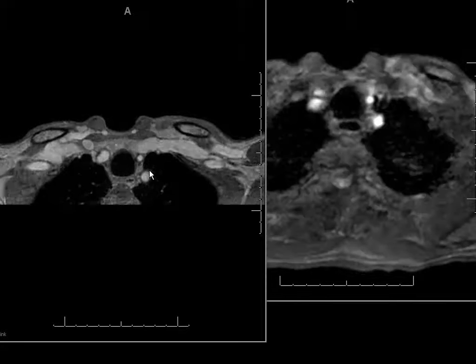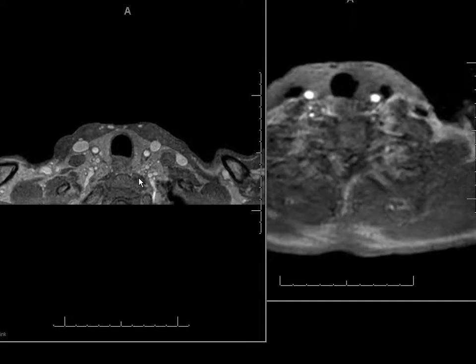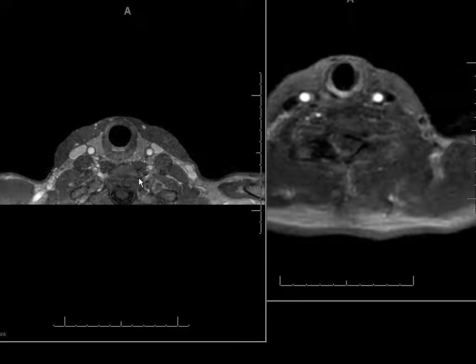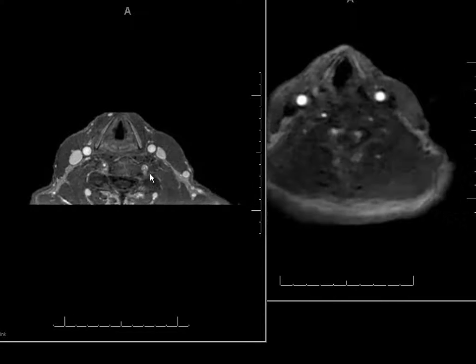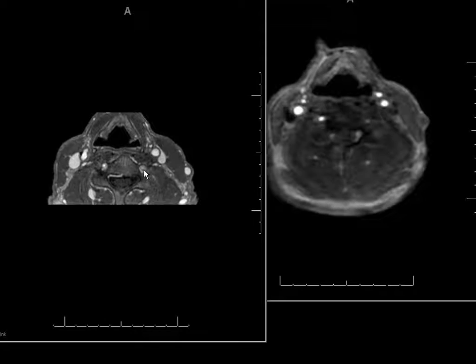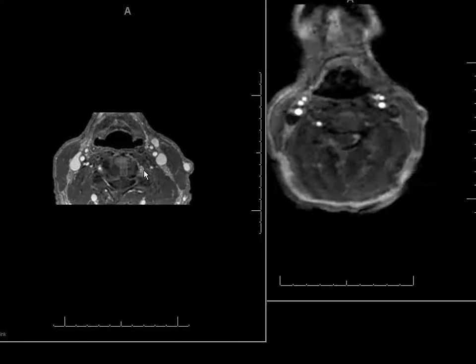It's approved for renal artery, but anyway, it demonstrated all the vessels very well, consistently in pretty much all the patients I have seen. The common carotid artery, the jugular vein, the right vertebral artery, the left vertebral artery, very tiny one, surrounded by a circle of vein.